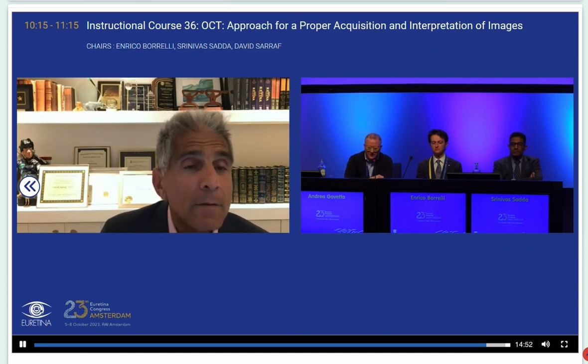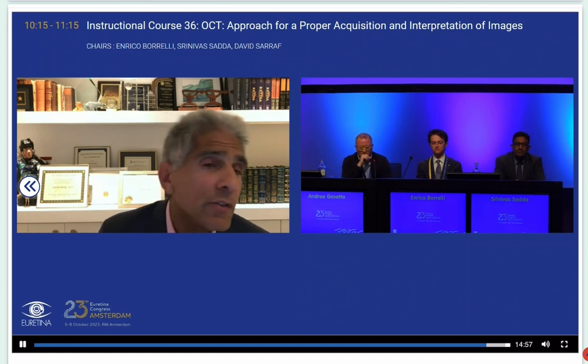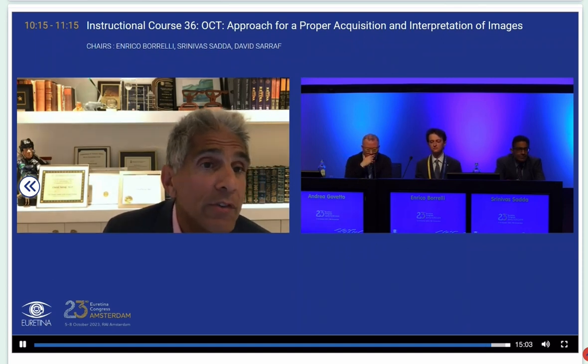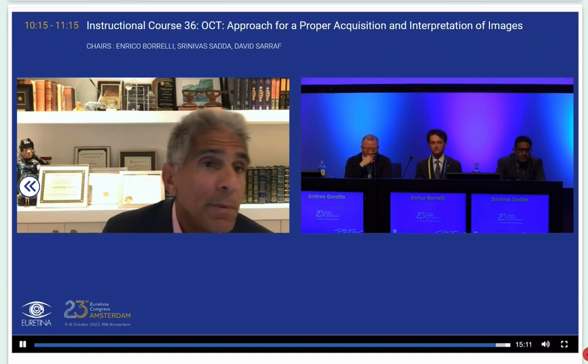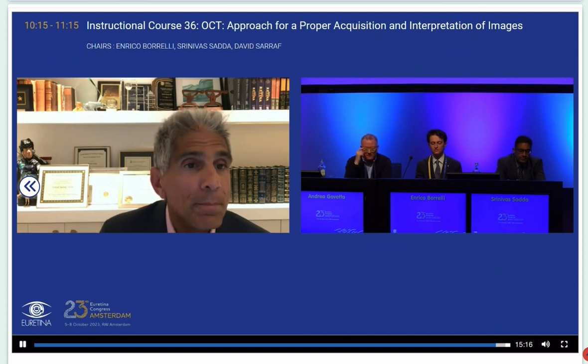Thank you. And you can see it either as a result of choroidal diseases, choroidal ischemia as in AMPPE and laser-induced maculopathy, or middle retinal ischemic diseases causing impairment of the DCP. So I think that's really cool. And the Henle fiber layer essentially joins the DCP to the choroid, and so I think that's why you can see them in either direction. Very, very interesting.